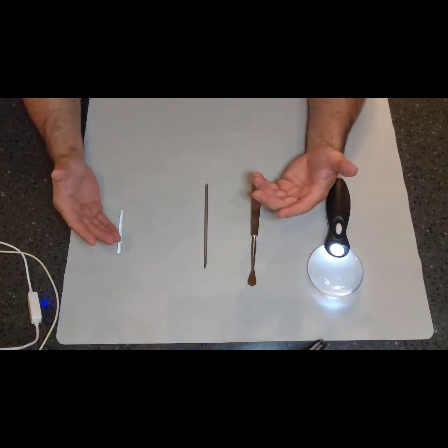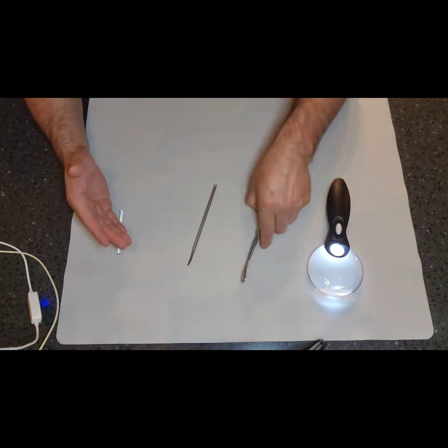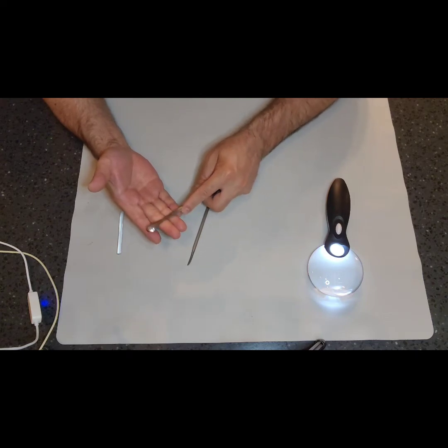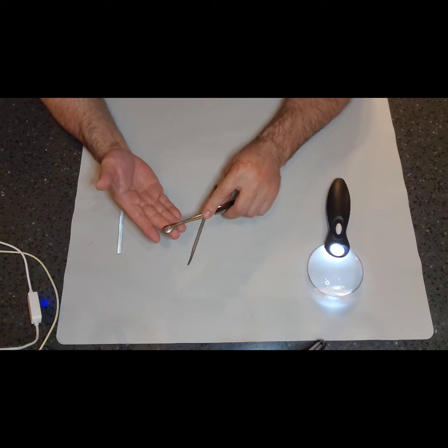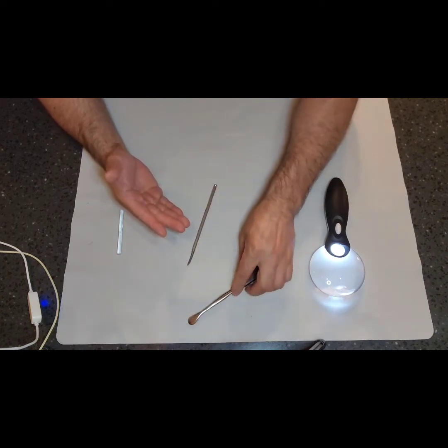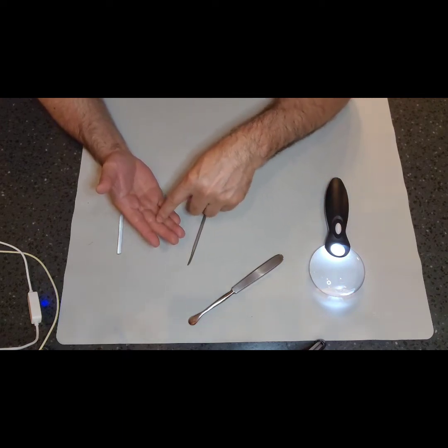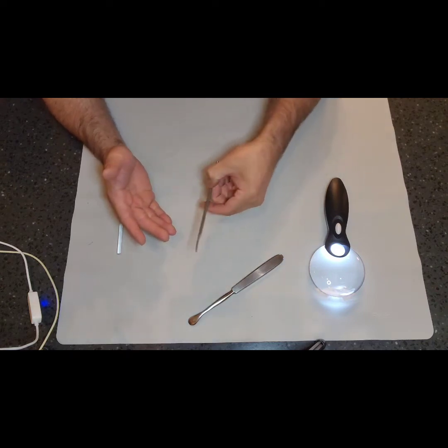So how would a surgeon do that? He would make a slit in the periosteal and then use a dissector or elevator to get under that periosteal. You don't want to destroy or damage it because it's a very nutrient-rich and protected part of the bone, but he wants to dissect it and remove it from the layer of that bone, flap it back or retract it off to the side so that he can perform surgery on the bone tissue itself and not the periosteal. All right, so that's what that does.